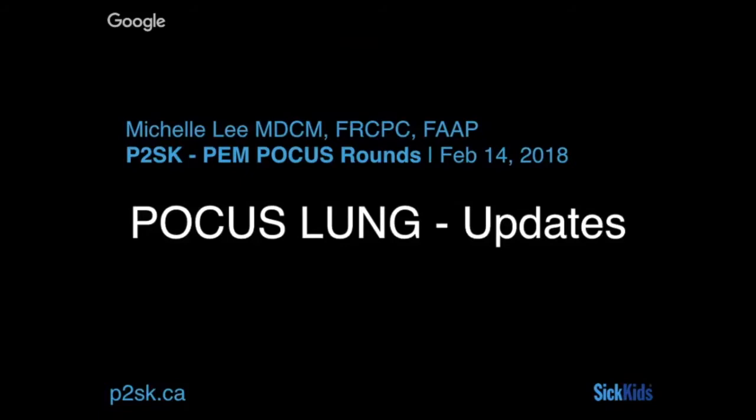I'm Michelle, one of the POCUS Fellows at the Hospital for Sick Children. Our topic today is POCUS of the pediatric lung, and it builds upon Mark Tessaro's lung screencast a few months ago, incorporating more cases and a bit more literature.